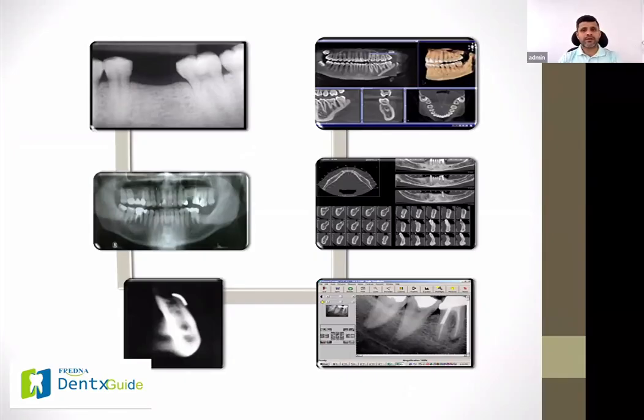it's a two-dimensional representation of three-dimensional structures. So we can never see the width of the bone on an IOPA. And secondly, there could be elongation or shortening depending upon what angulation we give. Next came OPG. The advantage with OPG was it covered the entire region, whereas IOPA gave only a localized region. But the disadvantages of IOPA persisted with OPG: it was a two-dimensional representation of three-dimensional structures, plus there is a lot of elongation in OPG. So all these OPG images are elongated.